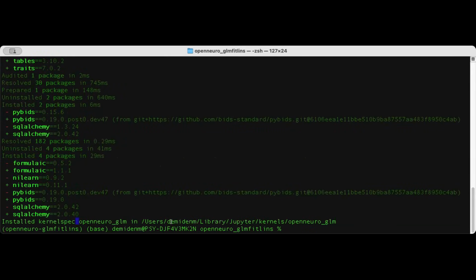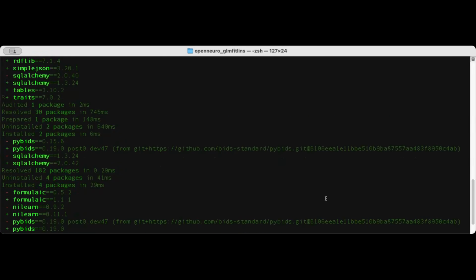Once it finishes, it also installs a kernel for your notebooks, because I like to check things in a notebook before I run them for my models. It takes, I don't know, maybe 1.5 to 2 minutes to run in a notebook to double check what my model design matrix looks like, rather than starting it, waiting some minutes, it failing, and then having to go back.